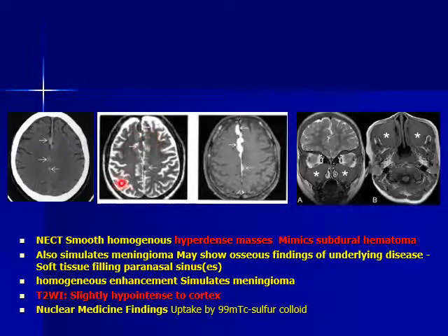We see, in addition to the other signs of anemia, extramedullary hematopoiesis. For example, these are initially hyperdense lesions along the falx cerebri, hypointense in T2 because of the high cellularity, as I've told you, and it markedly enhances after contrast administration. The same patient may show other signs of extramedullary hematopoiesis as enlargement of the diploic spaces, obliterating the sinuses in this condition. Okay, how to confirm that these lesions are extramedullary hematopoiesis?